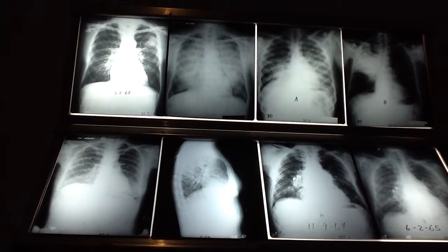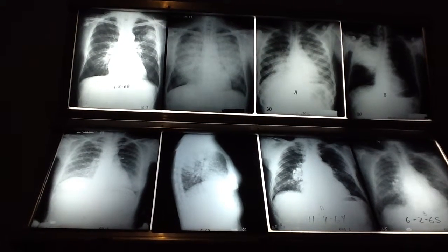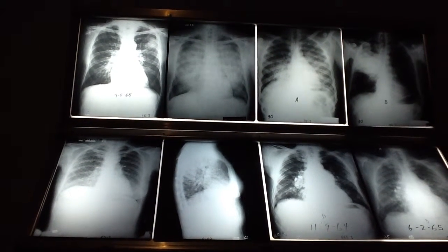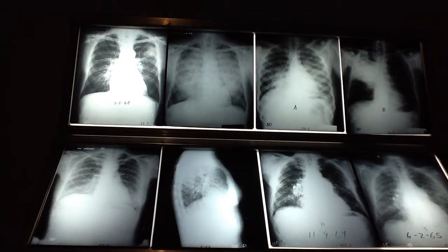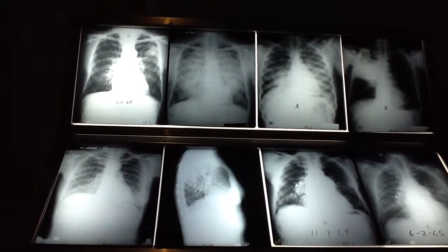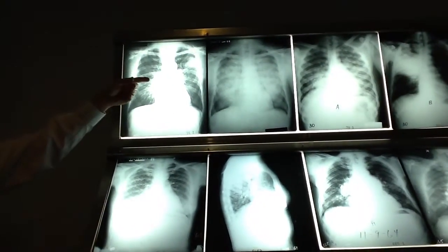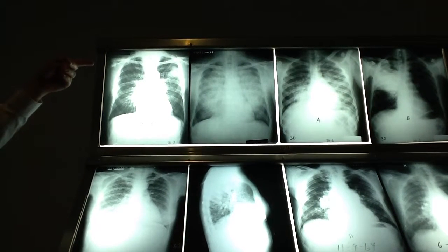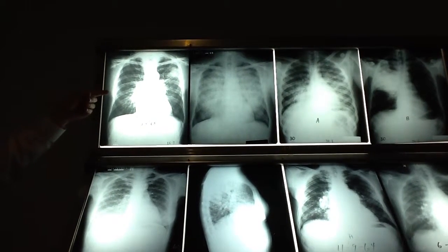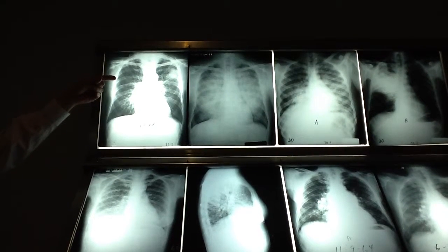What was number 6? Actually, it was 7. I'm sorry. It was 7. 6 was the fuzzy border. We already got that. Unless touching a fissure boundary, exactly. Unless touching a fissure boundary. There's no fissure boundary in the lateral upper left lung, is there?